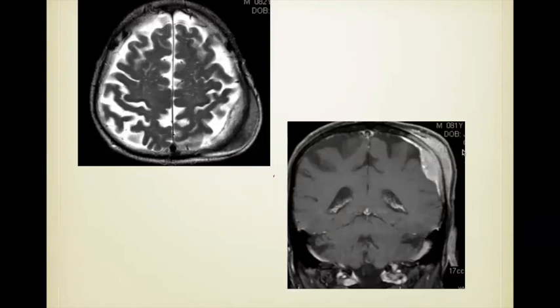When you see a lesion like this, the patient is 81 years old, that's through and through the skull, the two things to consider are a metastatic lesion, and the other possibility is an intraosseous meningioma. Meningiomas usually don't grow through the calvarium like this, and so when you see it on both sides, we call them intraosseous meningiomas in the sense that they may have arisen actually within the bone itself. But this particular case turned out to be an intraosseous meningioma. But I think metastatic disease in the appropriate setting is a reasonable diagnosis.